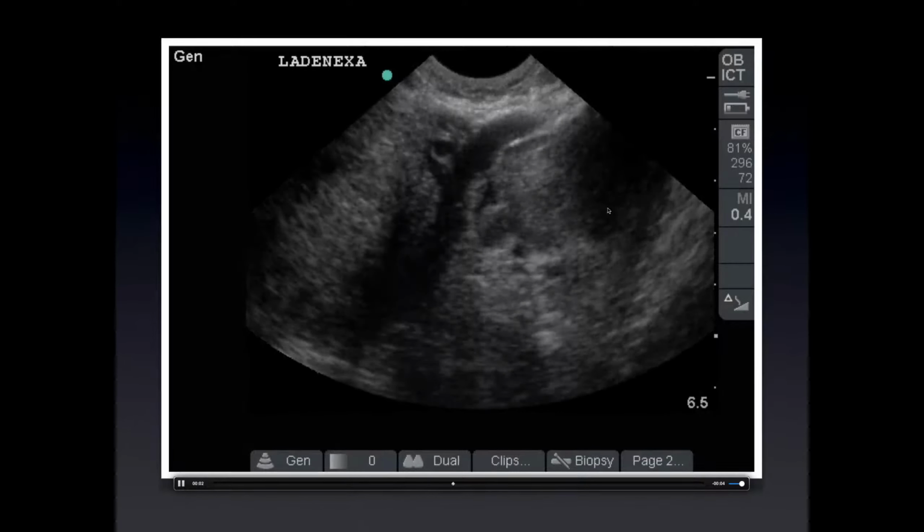Let's review the anatomy real quick. Again, here we have the cervix connecting to the fundus, containing the endometrium. Here's the adnexa with a tubal ring, a yolk sac, and a fetus. Here's another look at that pseudosac. A pseudosac is merely a blood-filled portion of the endometrium and not a true gestational sac.